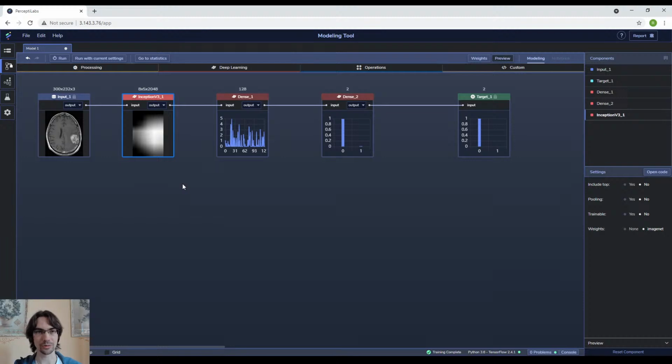All right. So the results we have so far is that VGG baseline is probably the best with training 96 and validation 90. With Inception coming pretty close, having 100 training and 86 validation.